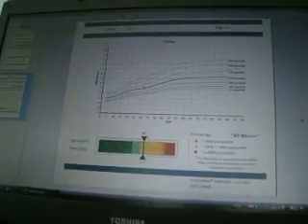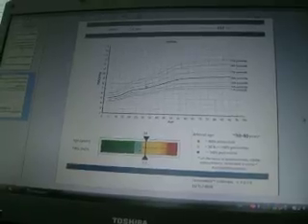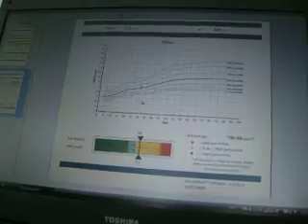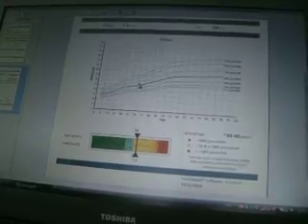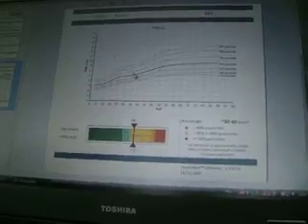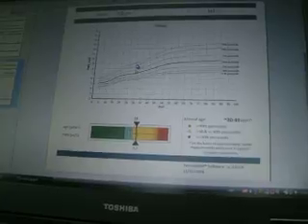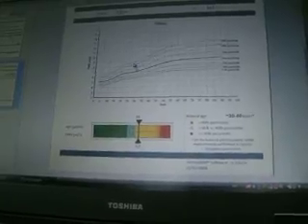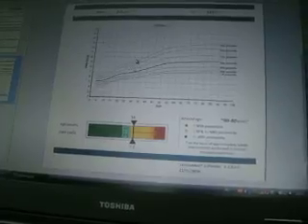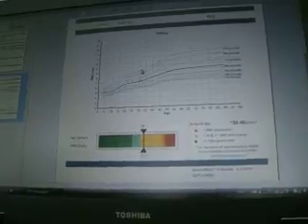So this is a reference chart based on the European population, which shows that according to her age, this patient is right at the average regarding the pulse wave velocity, so she is quite in a fine status now. Should she be above the 90th percentile, that would mean that she is in the extreme upper 10% of her age, meaning that she is in a high risk mode.